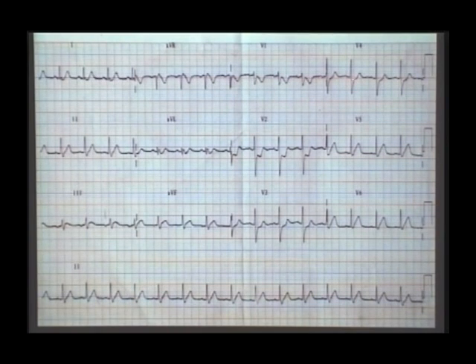See, compare your ST segment of V4 versus V5 and V6. What's happening? See L2, L3, AVF, there is a minimal ST elevation there and ironing out in V5, V6. So it is actually the earliest infralateral myocardial infarction. And why is there ST depression in V1, V2? Reciprocal. So this ST elevation is happening posteriorly also. When it is happening posteriorly, the V1, V2 showing ST segment depression is not a sign of subendocardial injury. It is a reciprocal sign of a subepicardial injury.